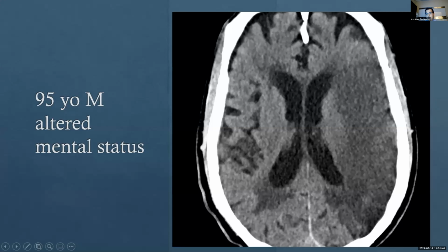So this is a patient where, if they want to know whether it's worthwhile to give TPA, it's probably not, based on this image, because they already have a very large stroke that's done. Unfortunately, this part of the brain had cell death, right? And so it's really not recoverable. And that's one of the crucial things we look for in these cases.